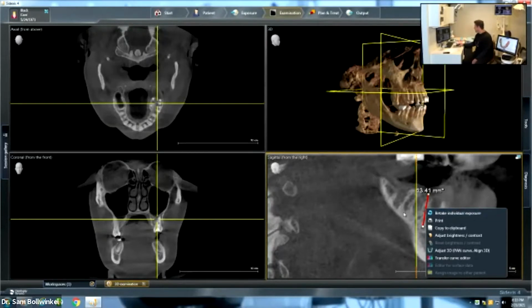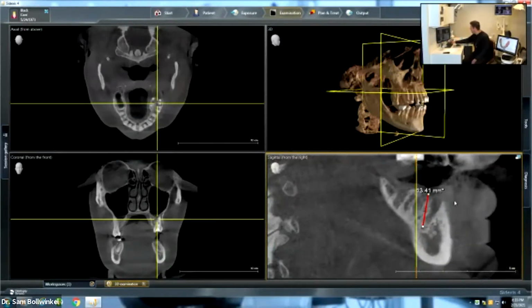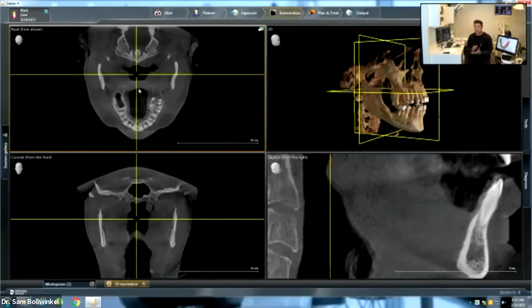So with that in mind, with a little bit of practice, going through and scanning an image and evaluating an image is really that easy and that quick. The great thing with this now is with the SICAT 2.0 software, I have an opportunity to actually bring a lot of this information together. So let's talk about implantology. I know when we were getting started, we had a couple of questions about implants and about the tech and the power of the software. We want to address those really quick before we dive too much into the software. What are our questions that we had coming in?